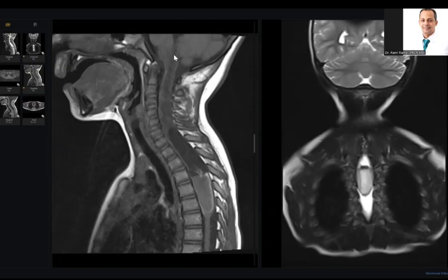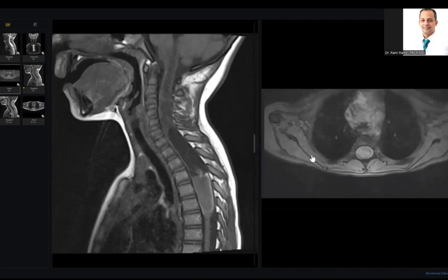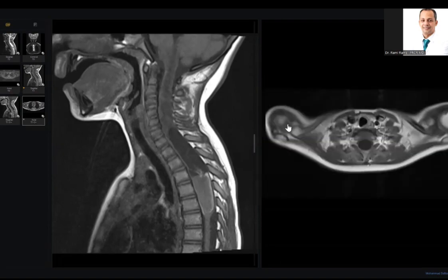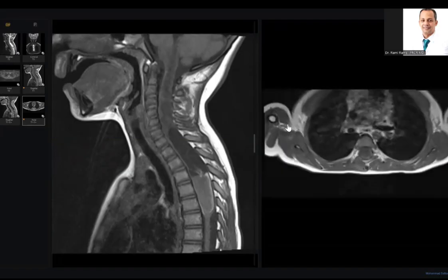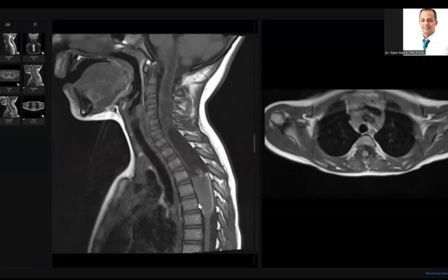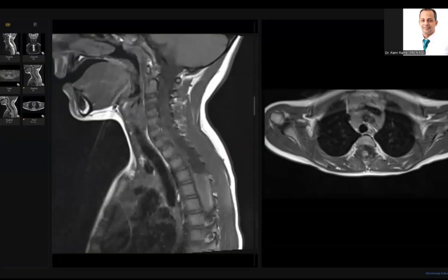I would like to check the axial images to rule out whether it's intramedullary or extramedullary. But the examiner will not give you all of this. Look here, I cannot see the cord separate, because it is compressed by this cystic lesion containing fat. At least give the examiner some possibilities.